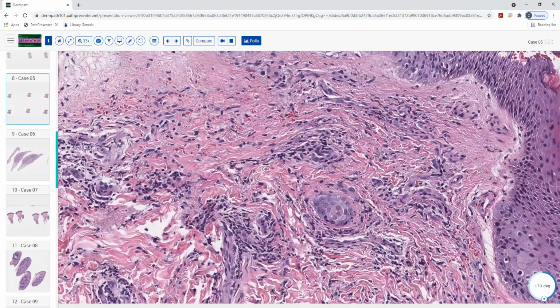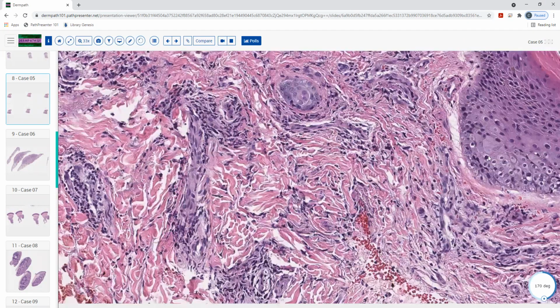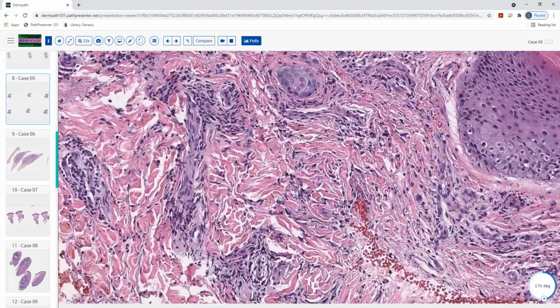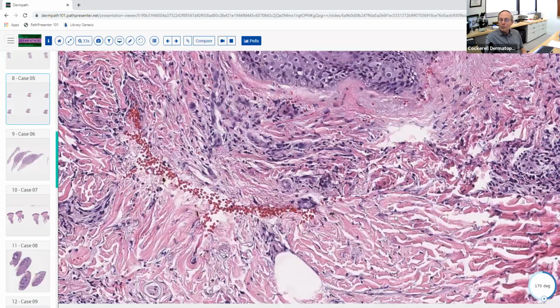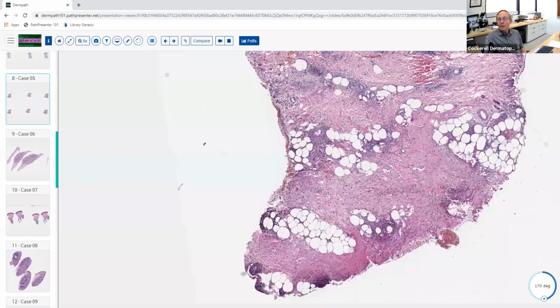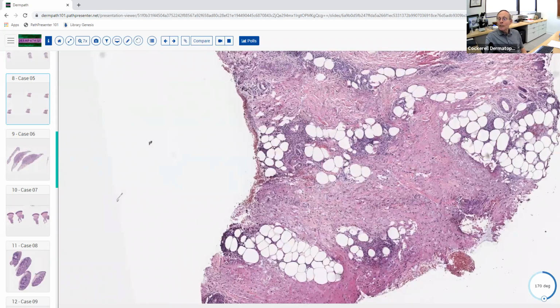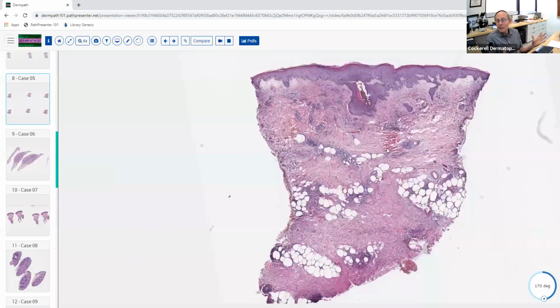So is it not just cellulitis? Yeah, this is cellulitis. This is a biopsy of cellulitis. You almost never see a biopsy of cellulitis, but if you do biopsy it, this is what it looks like. Basically what's happening here is you've got this diffuse pyogenic bacterial infection.